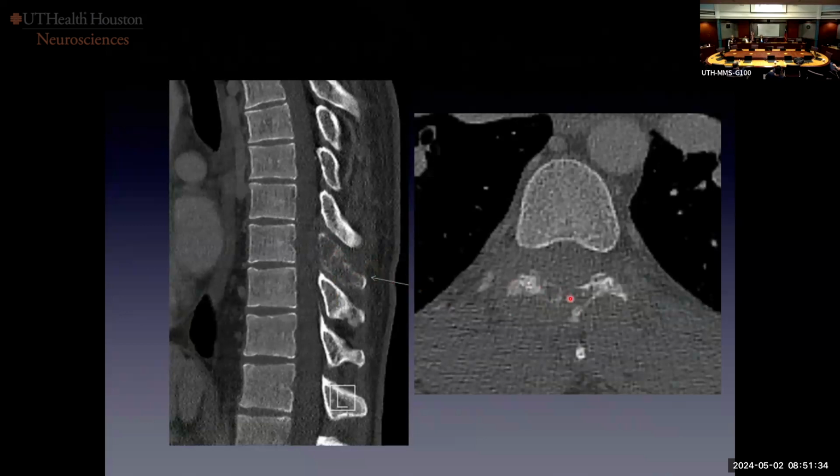That is what very aggressive tumors with a wide transition zone do. So we think small blue cell tumor. Statistically this should have been Ewing sarcoma, but it was not. It was a B-cell lymphoma, so still a small blue cell tumor, right? So I guess we're close.